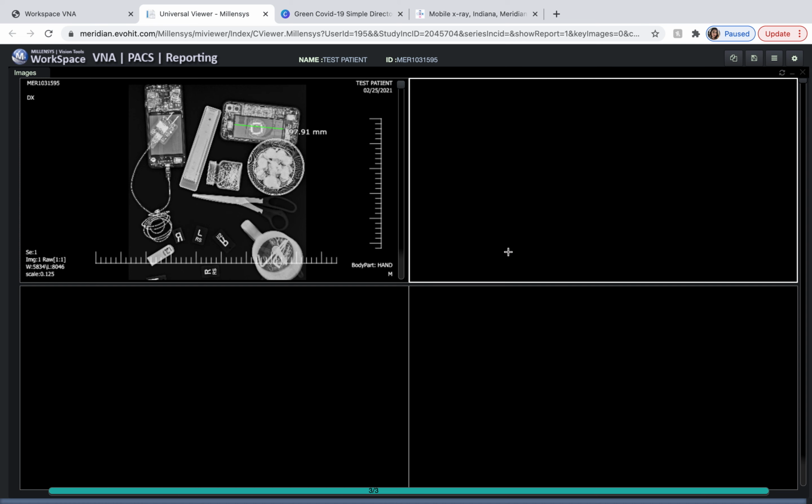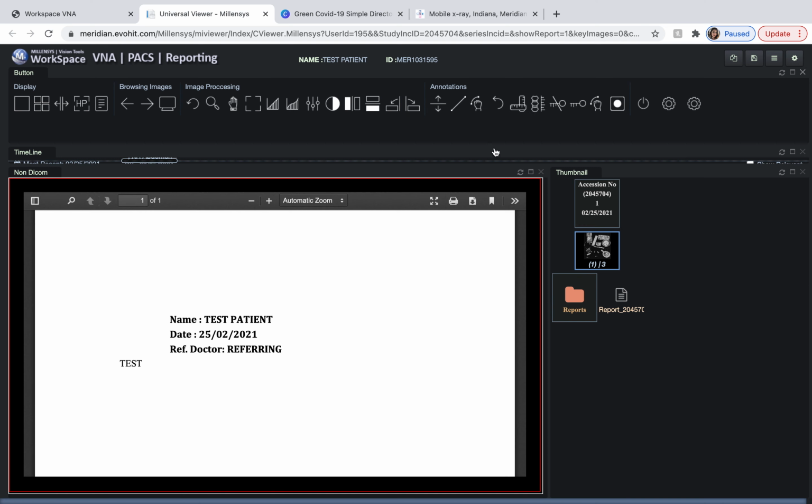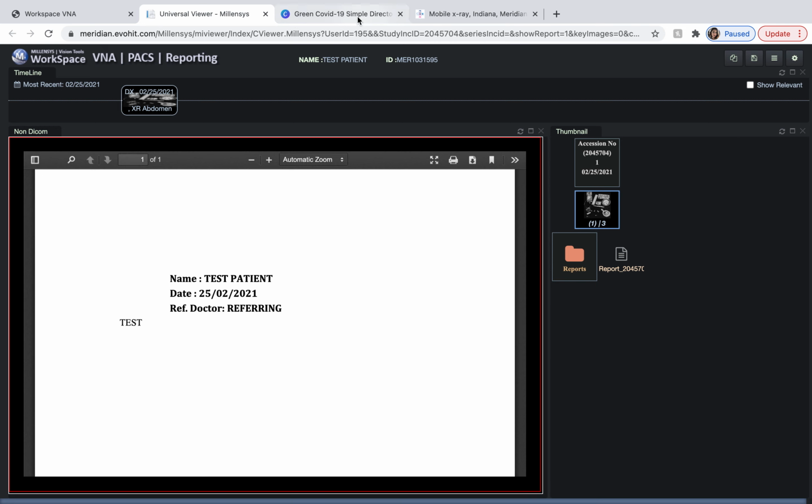It's still loading. Usually it pulls right up. It's probably just thinking, but we're gonna pretend it did, and everything's great.